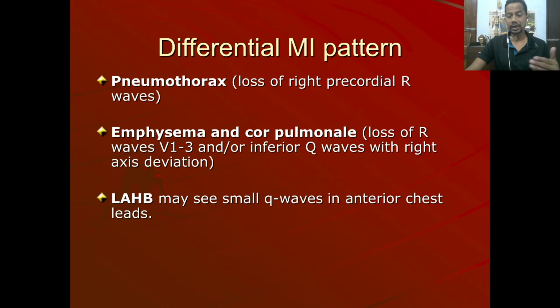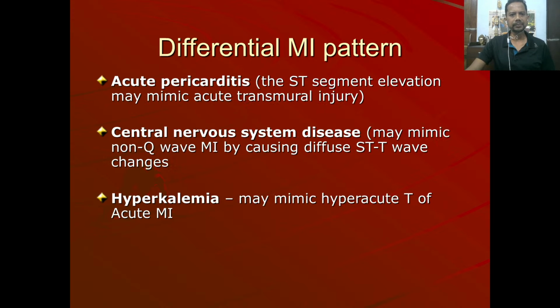But still again you think of MI, think of the worst diagnosis, rule it out, no problem, no shame. You can be wrong in a diagnosis, keep the diagnosis of MI first, and if it is just pure LAHB causing Q waves, fine, no problems. Let people laugh, but you have saved a life.